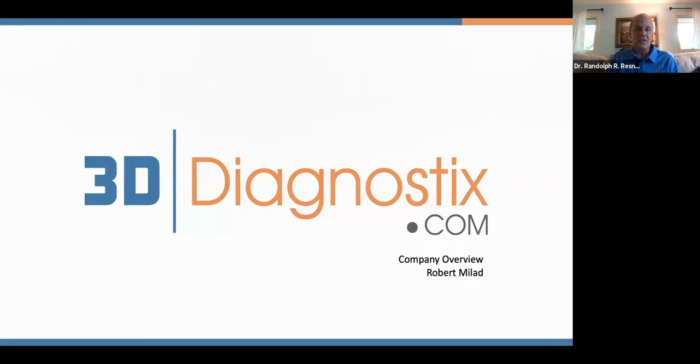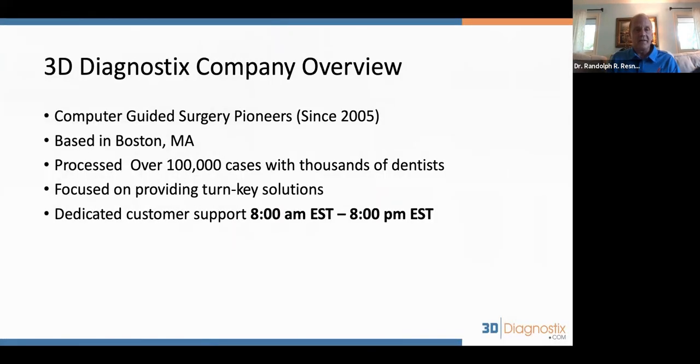Before I start the first case, I would like to introduce the software that we'll be using, and that's the 3D Diagnostics co-diagnostic software. So I'm going to have Robert just explain that rather quickly.